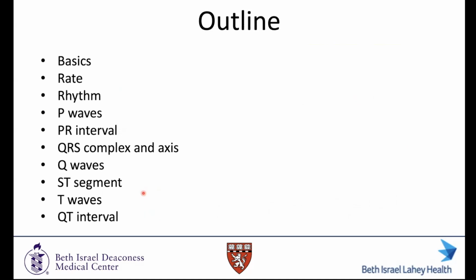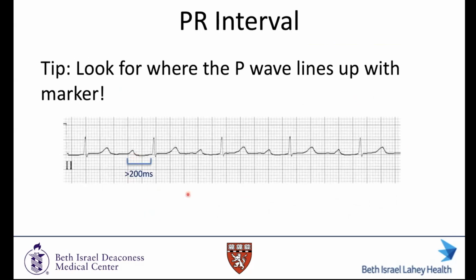You can see there that the PR interval, as you go back, is well over not just 200 milliseconds, but it's half of the next big box too. So this is a PR interval that's over 300 milliseconds.